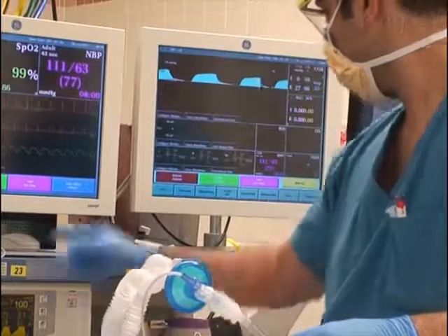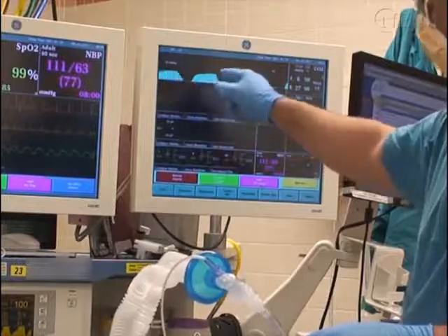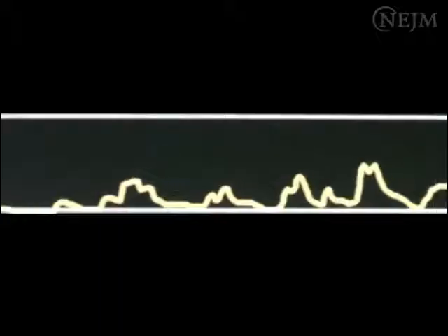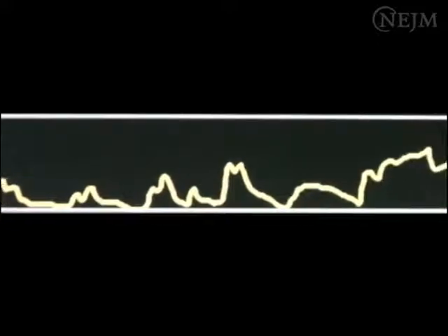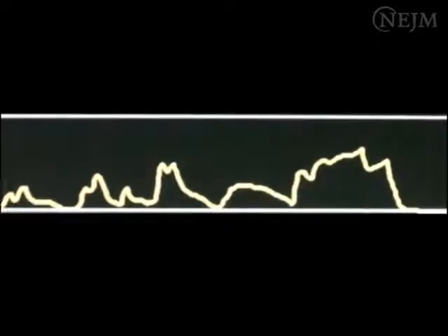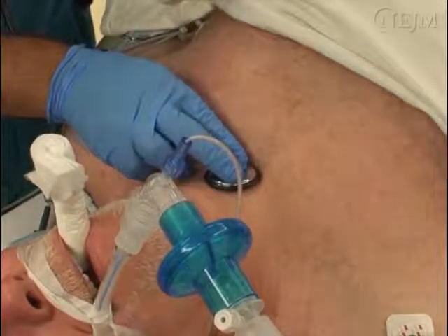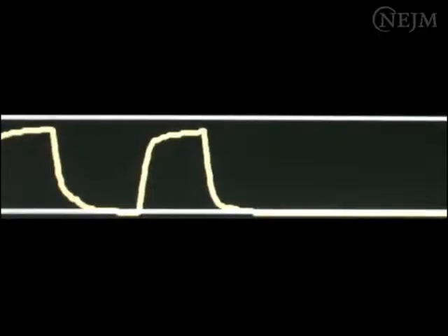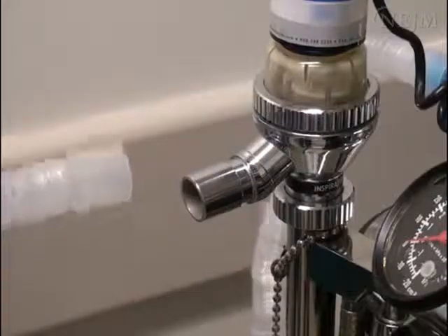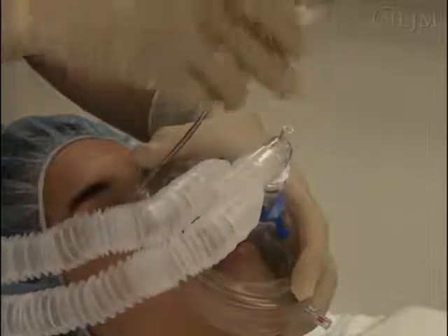Capnography is valuable for monitoring a patient's respiratory status. However, it is important to be aware of circumstances that may affect its reliability and to be able to recognize and interpret abnormal waveforms that may result from pathologic features or from technical difficulties. Capnograms must always be interpreted in conjunction with other physiological variables, and clinical judgment is important. Loss of the capnographic waveform may be caused by apnea, disconnection of a ventilator circuit, occlusion or dislodgement of an endotracheal tube, or occlusion or disconnection of the sampling line.